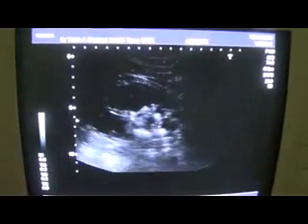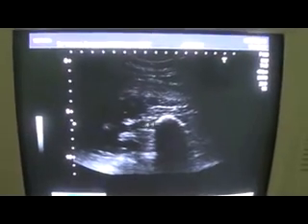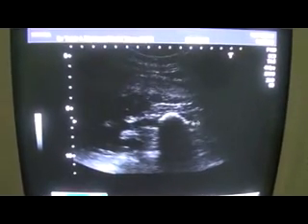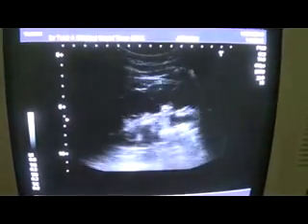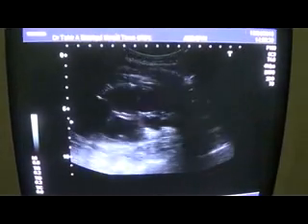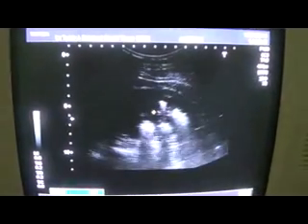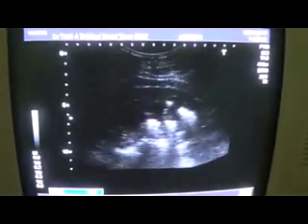So the larger one is here. This is the pelvis, and here this is the proximal ureter, and a 26 mm calculus impacted in that region, leading to formation of multiple calculi in the phase of being further calcification, poorly calcified at present.